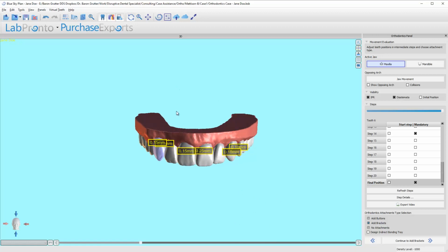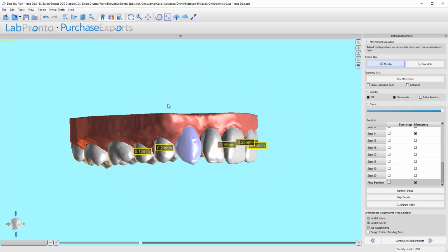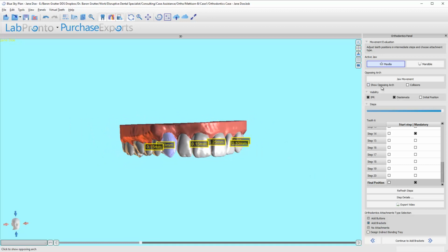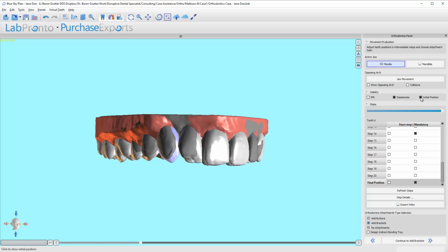So that's it for this setup. I'm not going to move forward to adding buttons or anything to this, because I'm going to send it back to the guy that has asked me to do this, before I add the buttons. But just as a little note, let's take a look at where I would place buttons.